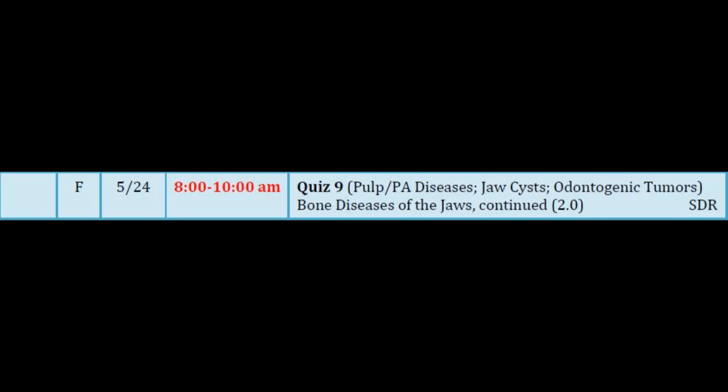Number 8. How would you describe this lesion? Lucent, opaque, or mixed? Lucent. Unilocular or multilocular? Unilocular, well-defined. Do you notice it's corrugated a little bit? It might be beginning to get some secondary loculations too. But anyway, the teeth are vital next to it. What's the single best diagnosis? Lateral periodontal cyst. And why does that rise to the top? Because this is an adult and it's in that mandibular bicuspid location. That location is very specific for this disease, so that makes this diagnosis absolutely the best.